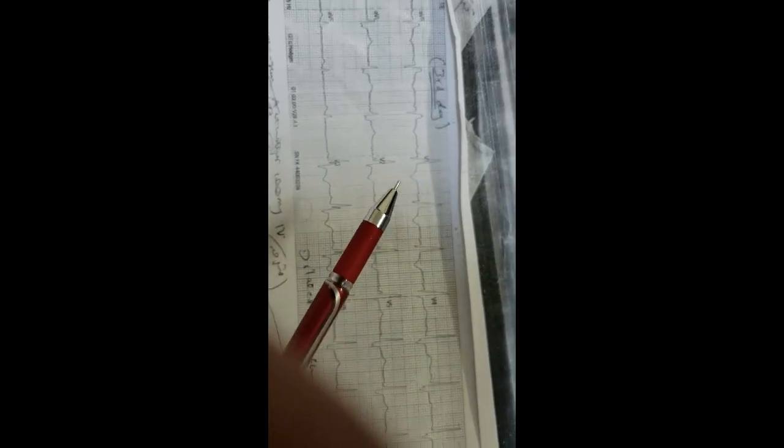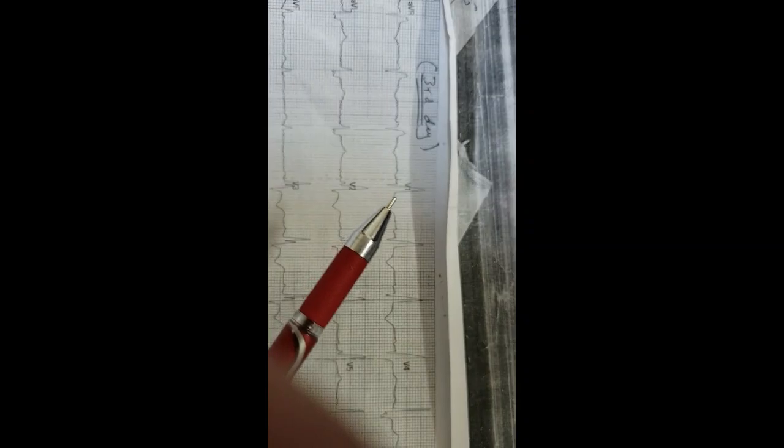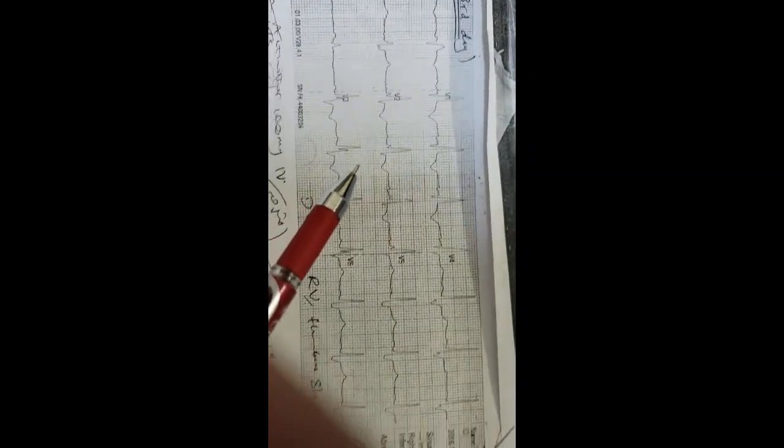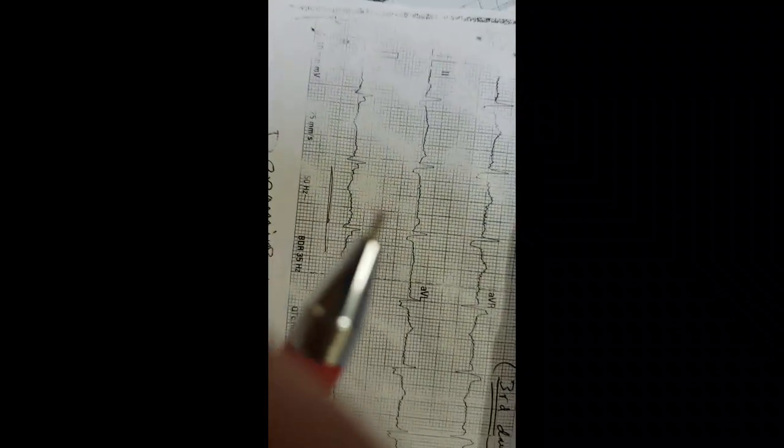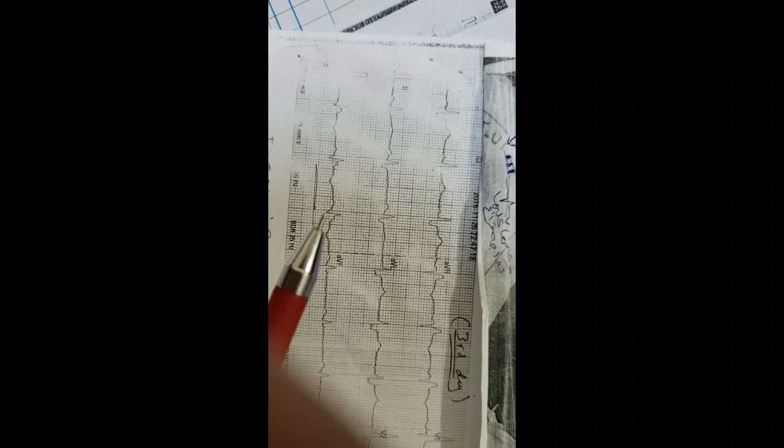Look here, the right ventricle starts to dilate, with a prominent R wave in V1 with T-wave inversion and a normal axis, but lead 3 and the inferior leads exhibit ST segment elevation and a small Q wave.